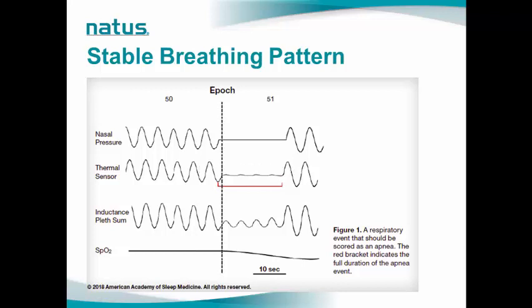So how can we define a baseline? We look at the 2 minutes preceding the onset of the event, and if the breathing pattern is stable, then we take the average amplitude and we consider it our baseline.